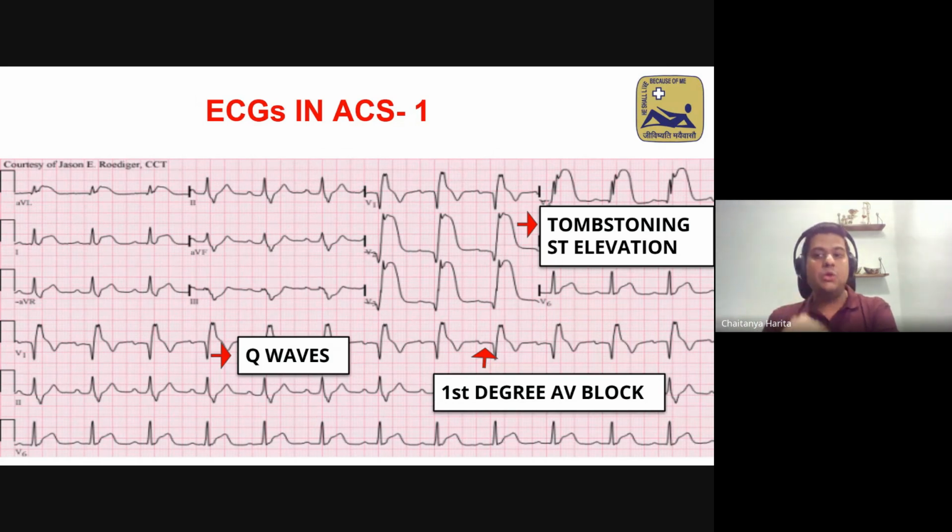The presence of Q waves means already dead myocardium, which means that by the time this patient has come to you, in that 2-hour period, there has already been loss of some amount of myocardium. So a Q wave always indicates myocardial death.